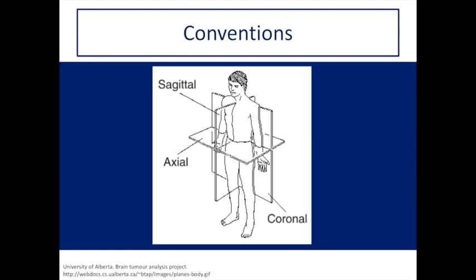So, just a little bit of an aside. Many of you might know this already, but CT scans are generally obtained in axial slices. Then you can create reformats in any plane that you want from that source axial information. This image shows the most common reformats that are made, the sagittal reformats and the coronal reformats, and it shows what they mean as well.